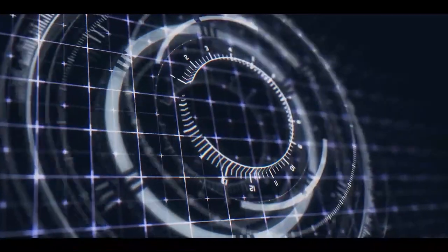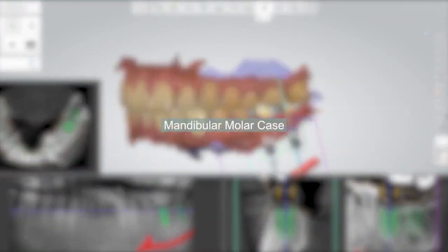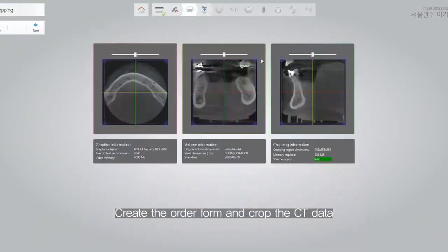Then we will learn the whole process of image merging, implant planning, and guide design through a video. This is a mandibular molar case. Merge CT data and scan data by selecting 3 corresponding points.